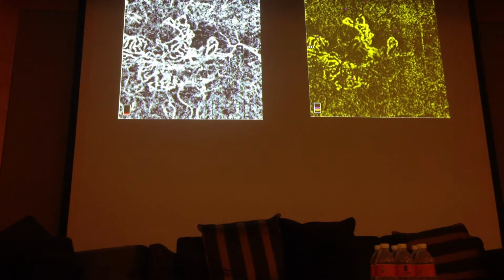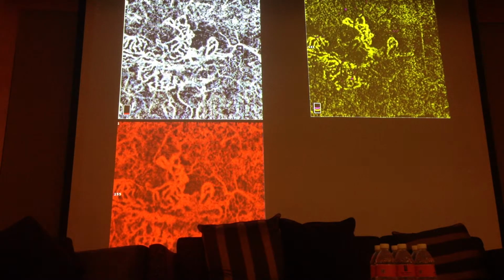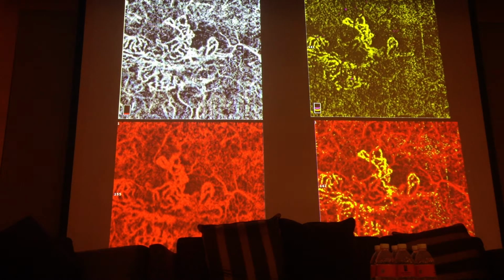In this case, we can color code vascularization in the choroid, in the choriocapillaris, and we can color code the vascularization in subretinal position. And making this, if you join the box information, you can have a follow-up of the patients like this.